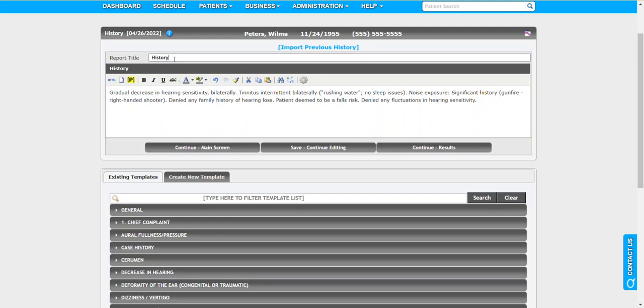If you do want to change the title of this, by the way, you certainly can. At any point, you can say, I'd rather not call this history, I might call it subjective, or some other phrase. You also have the ability to import previous history. So if you have seen this patient before, whether this be for the exact same evaluation, maybe a follow-up hearing test, or you are on the speech pathology side of things and you're creating a plan of care, and you want to move those results, the case history, forward into this report, whatever the case may be, you can simply click there and it will bring that text in.